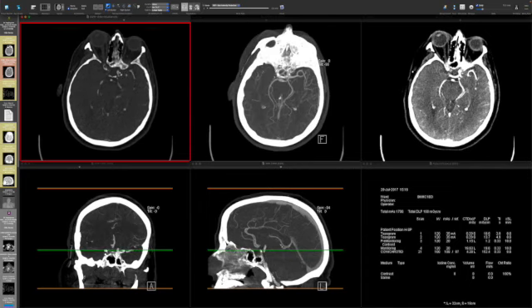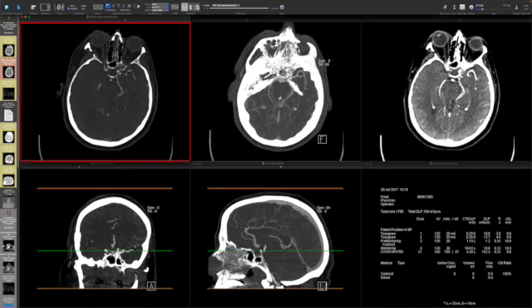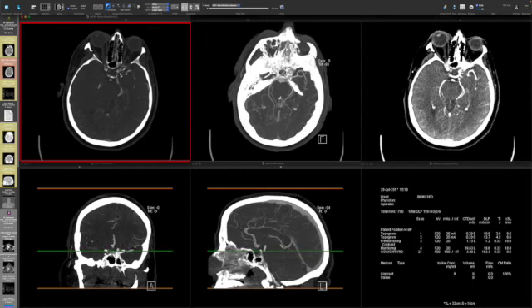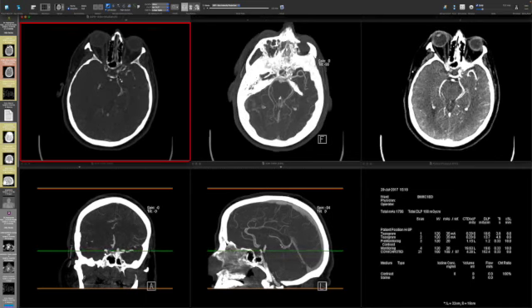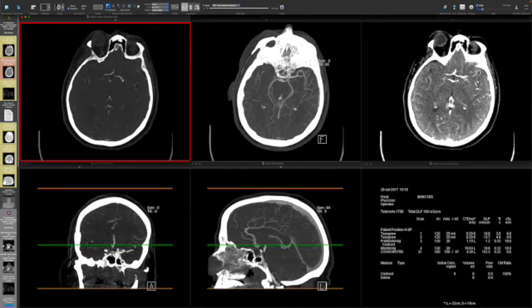But anatomically, it marks the location where the carotid artery extends through the dural ring and goes from extradural to intradural. That's important for assessments of aneurysms and things like that that are really beyond the scope of what we're talking about today. But anyway, ophthalmic artery origin, then we get to the clinoid and supraclinoid segments of the internal carotid artery. And as we follow it up here, and then to the carotid terminus here.